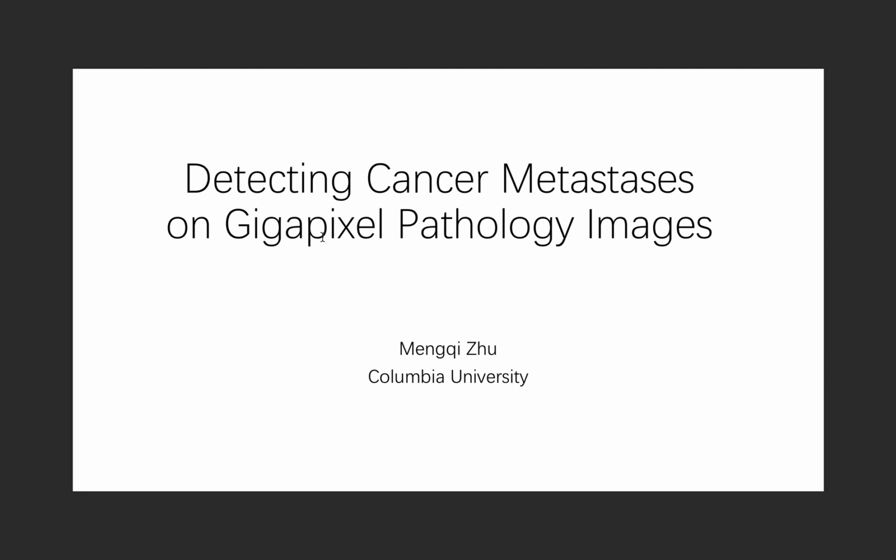Here is my final project for the course Applied Deep Learning, Detecting Cancer on Pathology Images. I work on the dataset CAMELYON16. It's a huge dataset of images collected independently from two medical centers in the Netherlands. My goal here is to develop a model based on this dataset that outputs a heat map showing regions of a biopsy image likely to contain cancer.